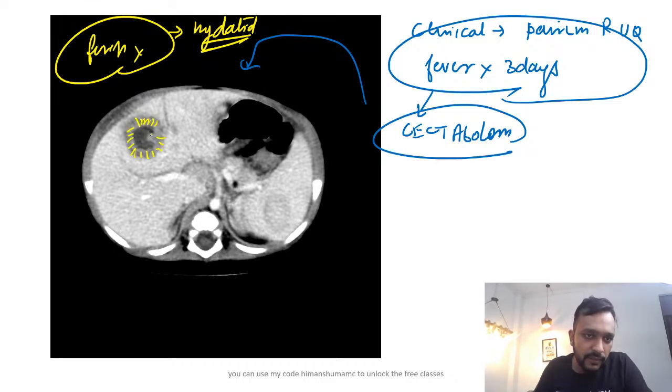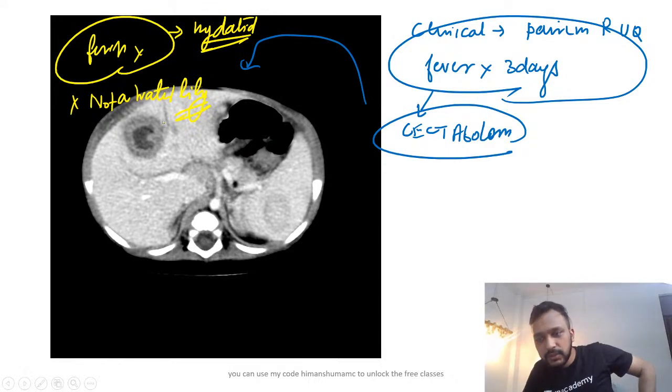In a case with hydatid cyst. So this is not a case of hydatid cyst. What other pathology? No, this is not a water lily sign. Not a water lily sign, guys. What else are you going to think?